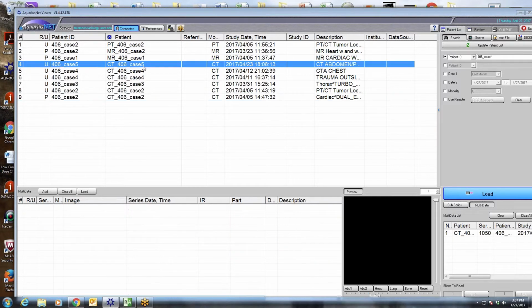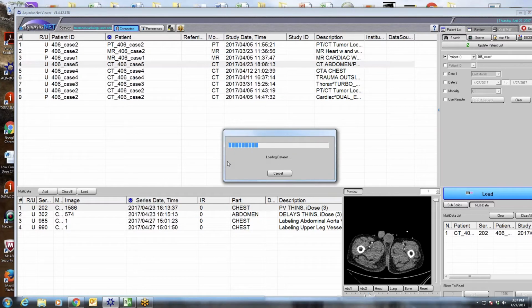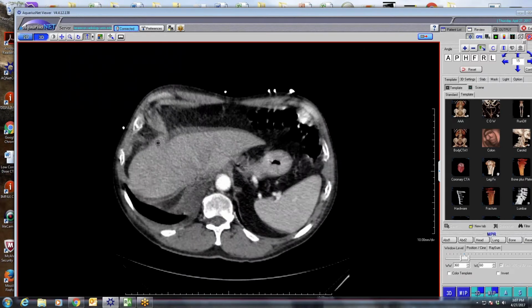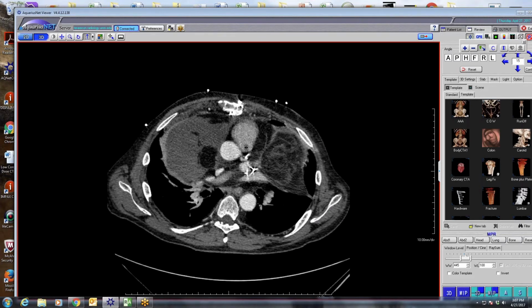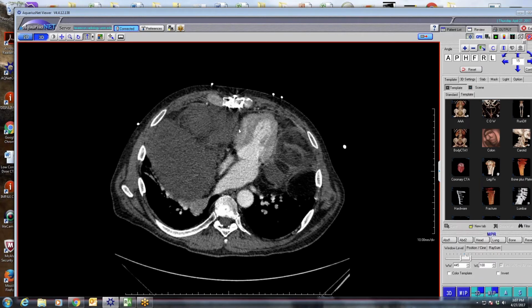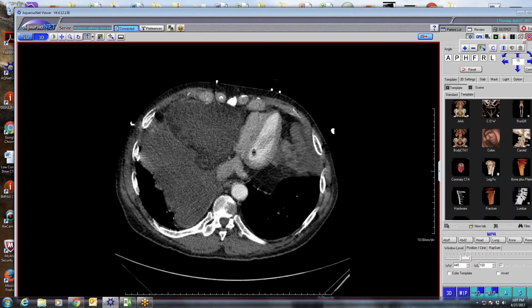This was a case that we just had, not really a conundrum in terms of the diagnosis, but just an impressive case of a patient with a large mediastinal liposarcoma who came in with symptoms of right heart compression. You can see here this very ugly, very large tumor, with a lot of fat attenuation but also a lot of soft tissue attenuation, kind of multi-lobulated, and you can see what it's doing to the right heart. The right atrium is almost gone, the right ventricle is quite compressed.